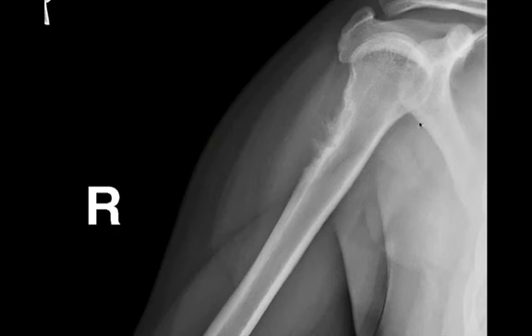All right, here's a view of the humerus, and here you see this lesion which is kind of scalloped out part of the cortex of the humerus, and you have this periosteal reaction or tumor matrix itself, in this case, within it. This was a juxtacortical chondroma, and this is what they look like. They kind of scallop out the cortex. They actually arise kind of in or just beneath the periosteum and will kind of grow into the cortex. If you wanted to say this was a cortically based lesion, I probably wouldn't argue with you too much, but in this case, this was a juxtacortical chondroma.